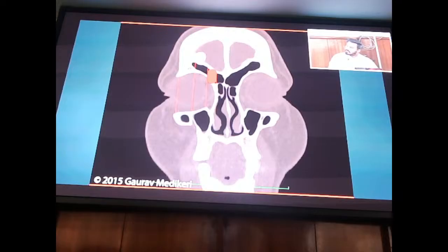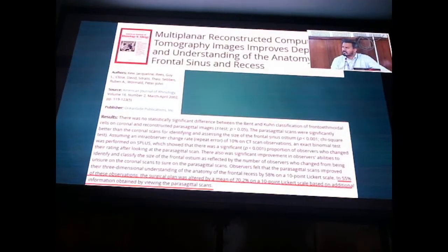So that is also one of the ways for you to figure out before surgery itself whether you need to do this or not. Majority of the time, people think, okay, let me first do a sinusotomy and let me try going this way, that way. It's very clear, you will not be able to go. So right off the bat, instead of wasting your time, you can just start with an outside-in drill out and then go in, that's it. So you will save a lot of time if you know how to read the scan.